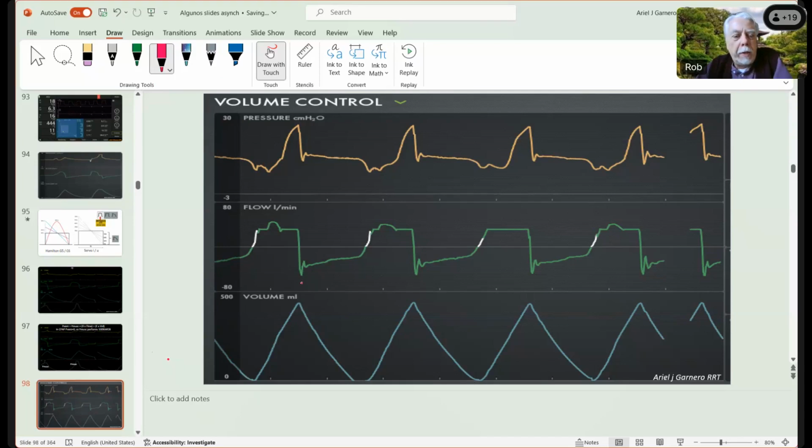Well, if we take a look at the expiratory flow curve, we see it's kind of straight. We see that it takes a long time to get back to close to being zero. It's not an exponential decay, or if it is, it's one with a very long time constant.